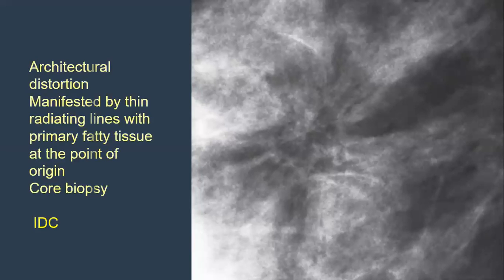Okay, this case is architectural distortion manifested by radiating lines to a fatty center, central point or origin. Core biopsy revealed invasive ductal carcinoma. Look at this area, easily missed on mammography. Do you agree or not? Yes, it was invasive ductal carcinoma.